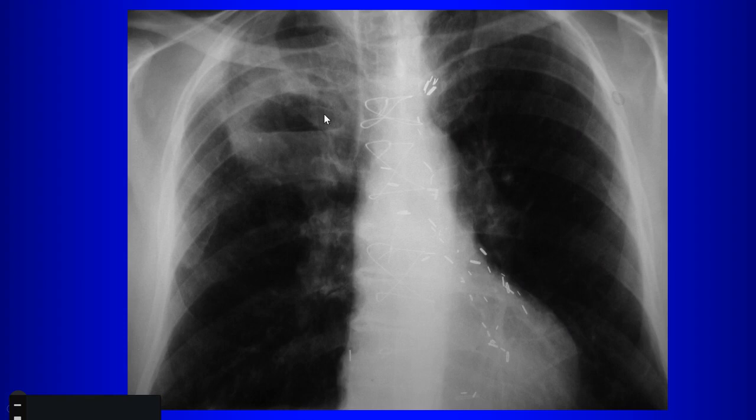So here we have a large cavitary lesion. Do you think this is benign or malignant? Could be. I could go both ways. But I think malignant. Why? Because there's just one. Just one? Any other finding? What's that? Air fluid level. Well, an air fluid level you can see in any cavitary lesion. It's thick. Thick wall, right. Yeah. So there's marked thickening of the wall here.